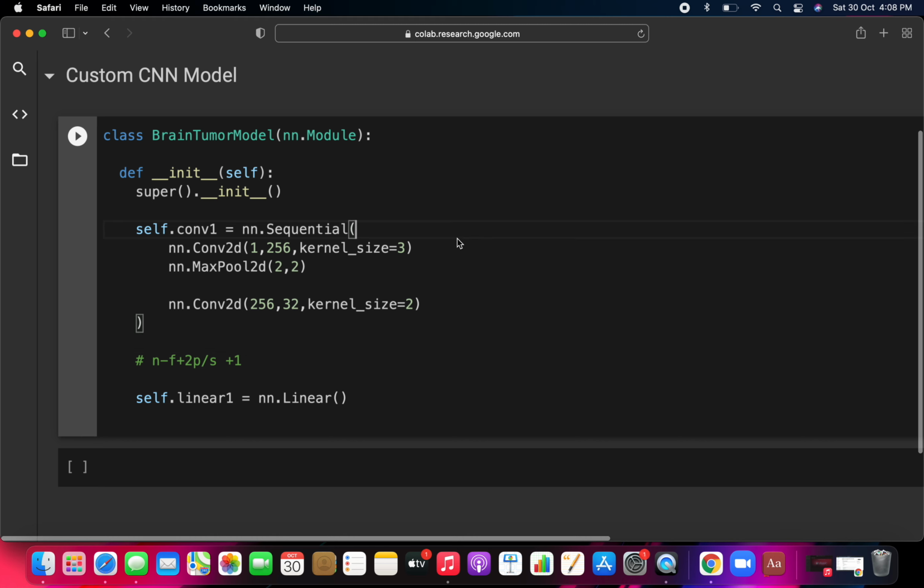During the first operation, this is what you pass here. Whenever you create an ANN, that ANN acts as a hidden layer inside the convolution network, and the input layer has a number of neurons that must match.